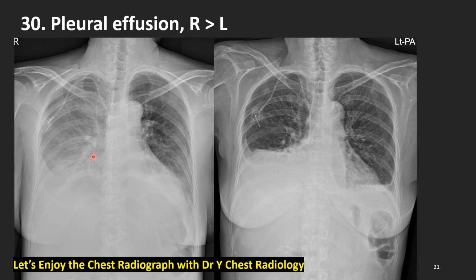What about the same patient in AP supine view? Yes, diffuse haziness of pleural effusion. But how do we know this is pleural effusion or air bronchogram of consolidation? Yes, that's it. Pulmonary vessels. Although we are looking at the bronchogram, if we see the pulmonary vessels here and there, that means the lung is relatively okay.